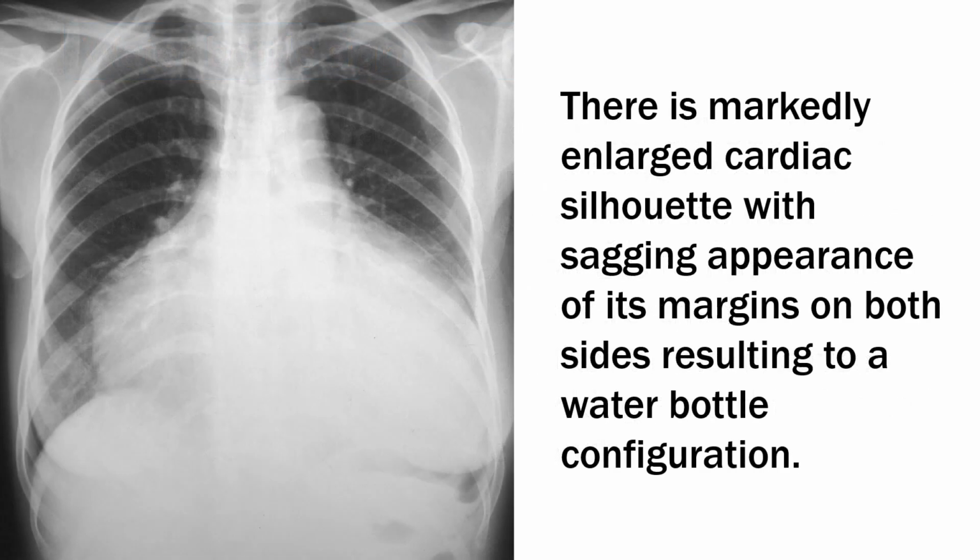In this X-ray, there is a markedly enlarged cardiac silhouette with sagging appearance of its margins on both sides, resulting in a water bottle configuration.